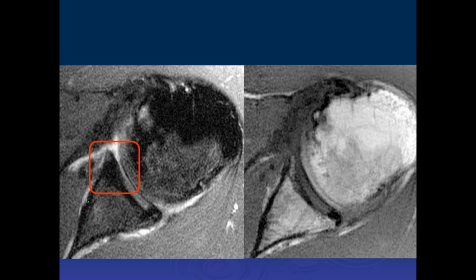And here's the CT. What do you think on the CT? Oh, I'm sorry, the T1, excuse me. Yes, on the T1, the posterior labrum looks blunted, and the anterior labrum I'm not seeing well, and there's spurring of the anterior glenoid rim. That's not a CT. No, it's not, it's a T1. So it looks like the anterior labrum's kind of replaced by anterior spurring of the glenoid.